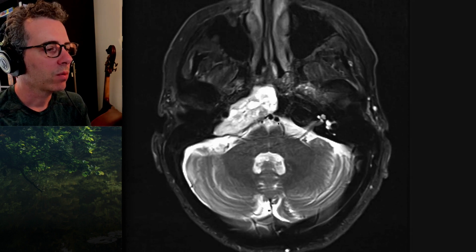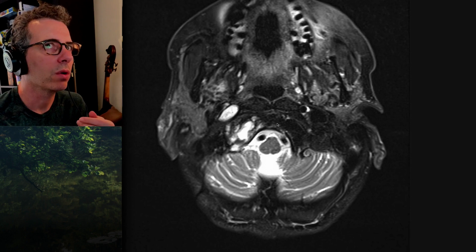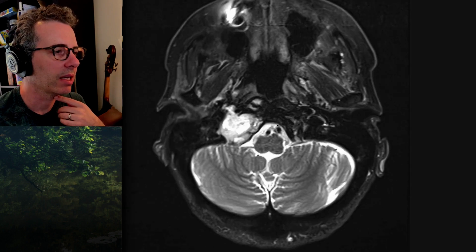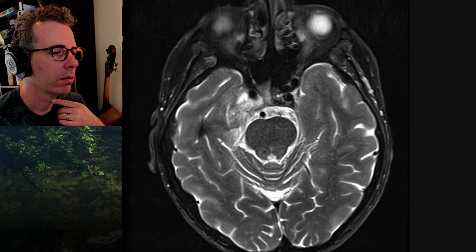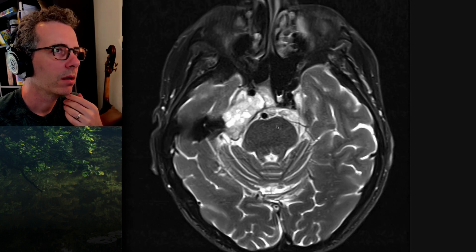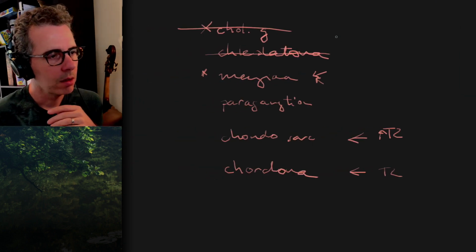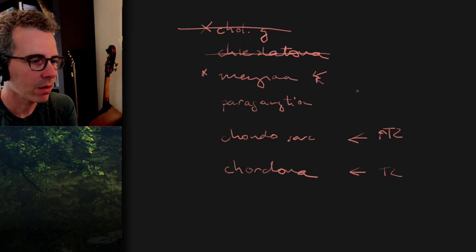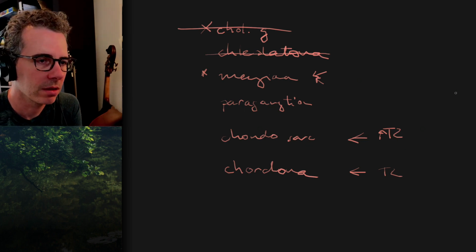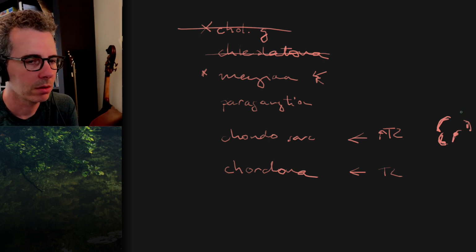Okay, so there's one more lesion. If you were reporting this, what would you be wanting to look at or suggesting should be obtained? I just like looking at non-contrast CT brains to look at the bony involvement. Okay, and how would that be helpful with this list? What would chondrosarcoma show you on CT? Rings and arcs. Yep, so you get chondroid calcification, popcorn-like. What about chordoma?